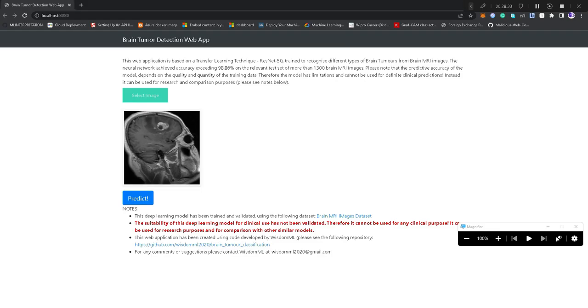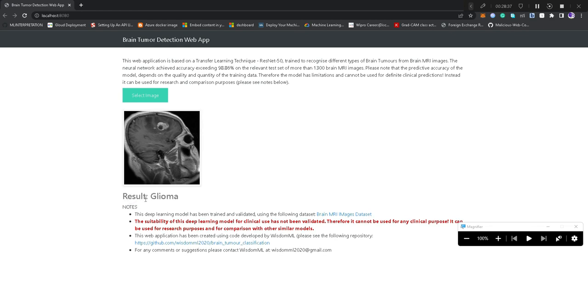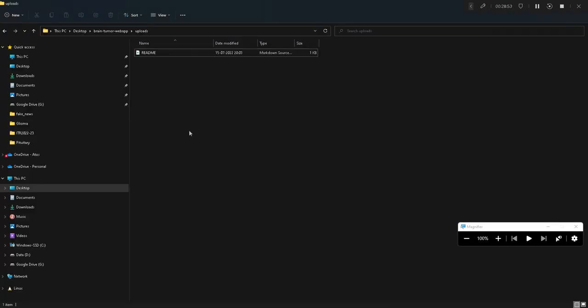And once we click on predict, it is so fast. It will be uploaded, get the predictions, and you will not see the image here. That is the best part.